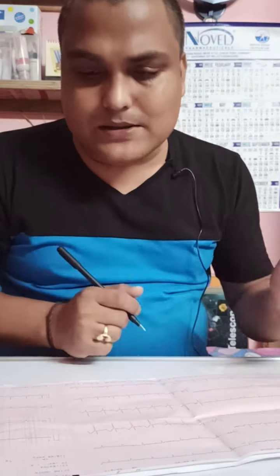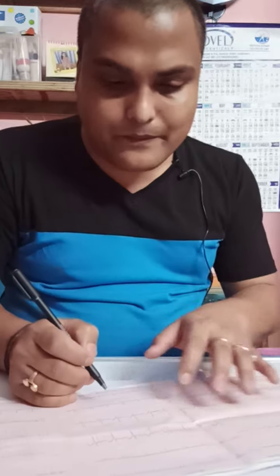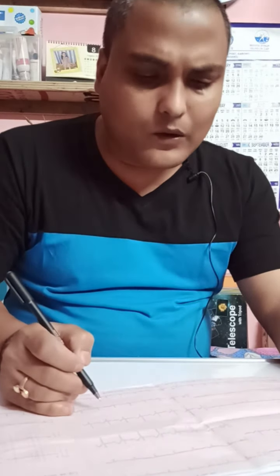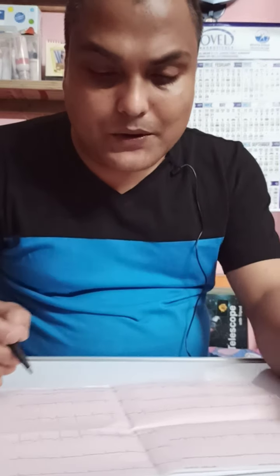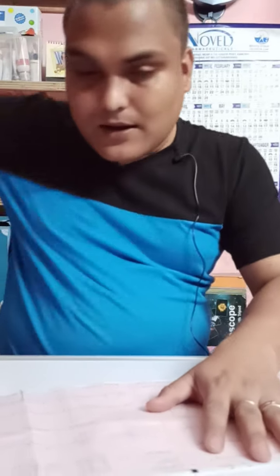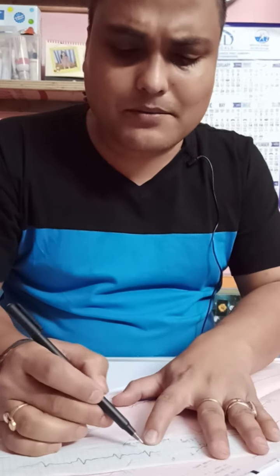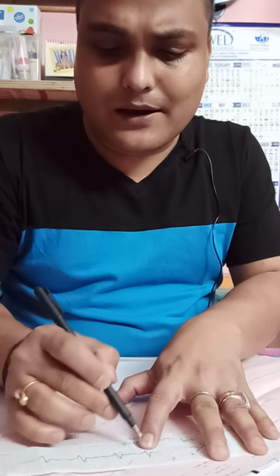These are some basic points, remember them. One more question is asked: show me the waves. You show on the ECG wave tracing the P wave, Q wave, R, S and T, and here is the ST segment.